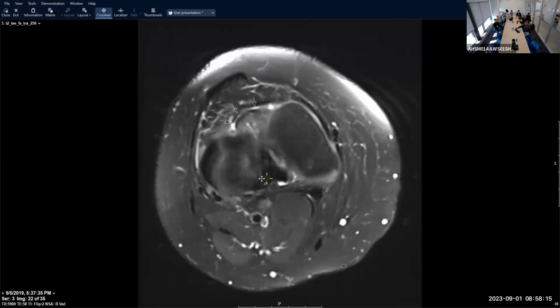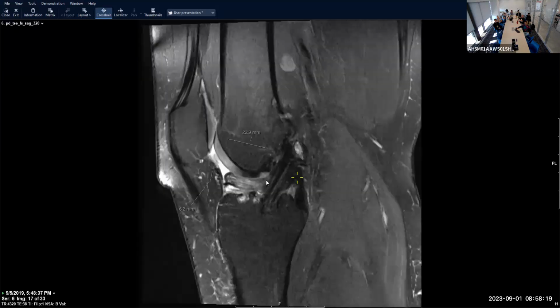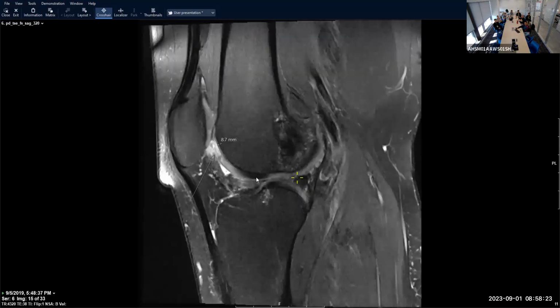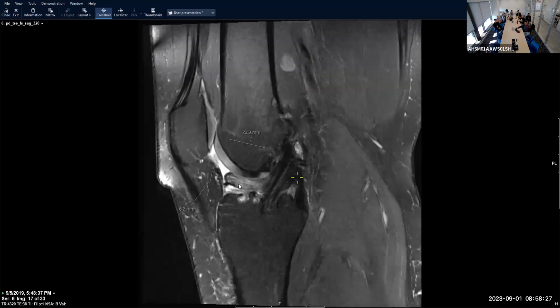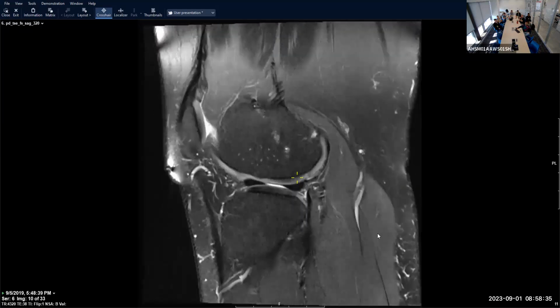It's just arthrofibrosis, scar tissue that forms in the deep aspect of the intercondylar region, and this can result in inability to extend fully and locking, so they may go in and debride this. They call it a cyclops lesion because when you go under the scope, it looks like there's an eyeball staring back at you, I guess.